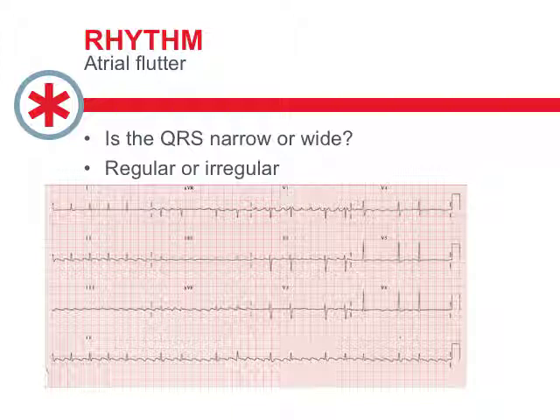But if you look at the space between the QRS complexes, you'll see these little sawtooth waves. And those waves up and down are the waves of atrial flutter. They're also seen very well in lead V1 if you want to have a peek. But lead 2 is the best one if you look at that rhythm strip. And so what you get is basically a variable conduction at the AV node. And so the QRSs are fairly regular, but occasionally they can be a little longer, a little less. But these sawtooth waves are the real giveaway that this is atrial flutter.